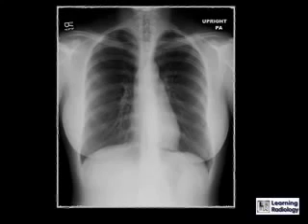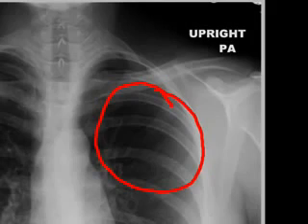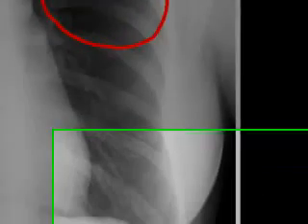How this works in everyday practice is shown on this frontal chest radiograph. We can see air density here in the left upper lobe of the lung. You can also see air density in the room surrounding the patient. We can see fat density in the chest wall. We can see fluid or soft tissue density in the right upper quadrant of the abdomen with the liver.